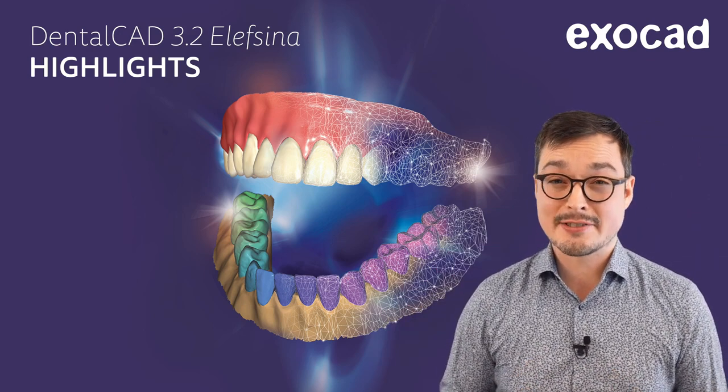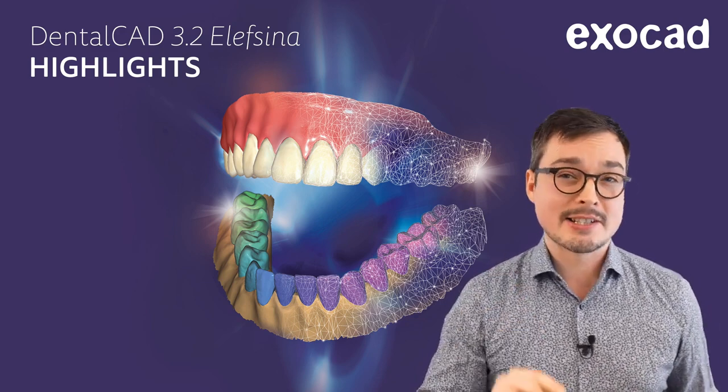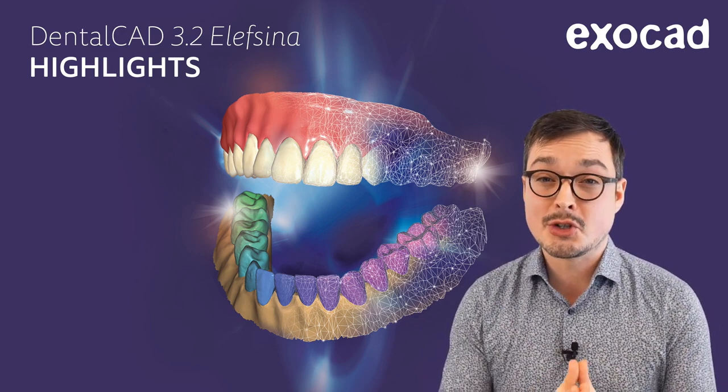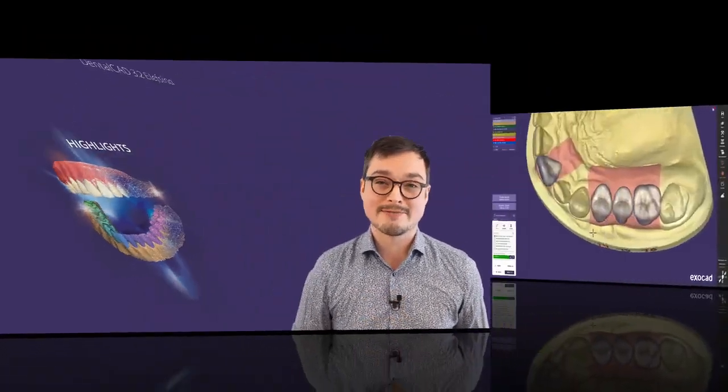DentalCAD 3.2 Elefsina presents plenty of new features, more automation and seamless integration to you. Let me introduce you to our personal highlights by starting the brand new release right away.